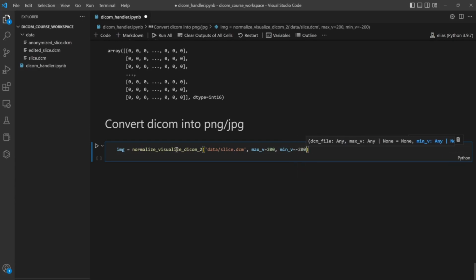Now if I do that, I have the image. If I want to show it, we can just do the visualization. Otherwise, if I want to save it, then I need to leave it like that and use the part below to convert this, because here it is an array. It is always an array since I am not doing the visualization. So if I want to save it or do anything with it, I need to convert it into an image.